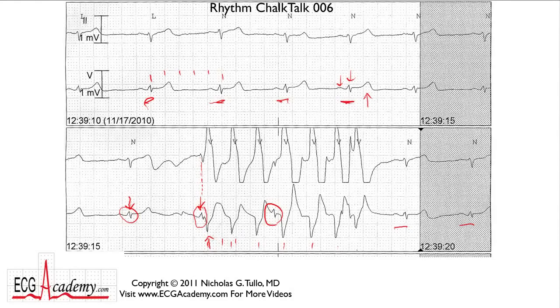Well, let's get our calipers back out again. And if we map out these signals, and given that there's a little bit of sinus arrhythmia and you'd expect a little bit of irregularity, there seems to be something that's right here. And if you bring our calipers back out, this beat occurs on time, with plus or minus a couple of small boxes, but remember there's a little sinus arrhythmia going on.